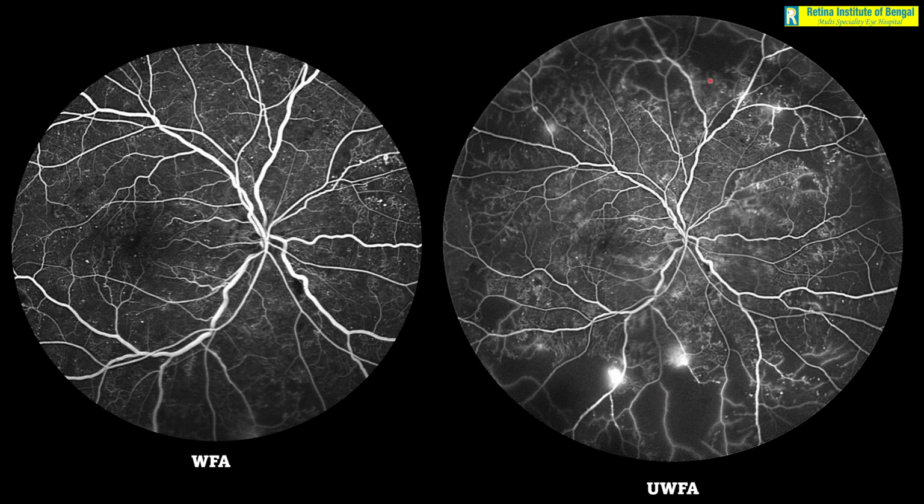Now you may wonder how common is such a scenario where the pathology of the diabetic retinopathy is primarily in the periphery and we would have missed it without doing an ultra wide field angiography. Well, it is not uncommon. It is seen in 10 to 14% of the cases as reported by DRCR protocol AA, and we can discuss that protocol sometime in the future.